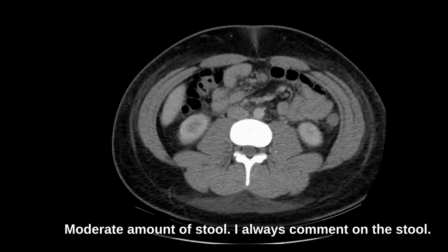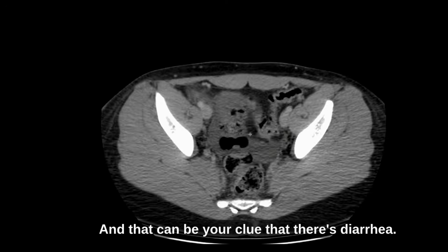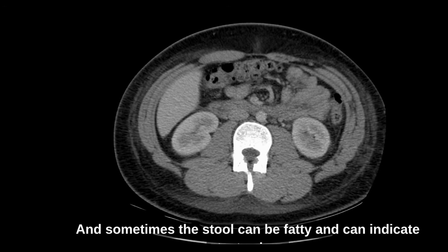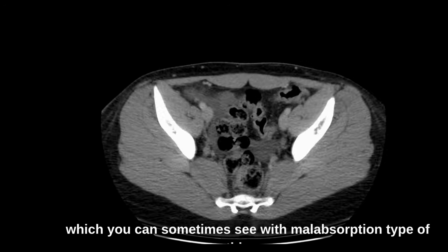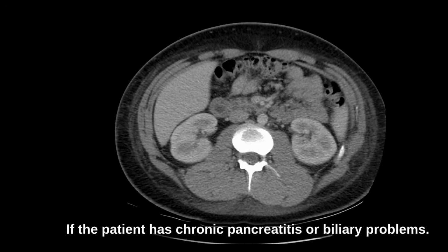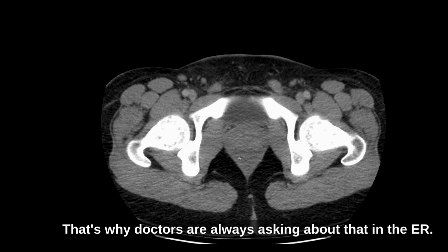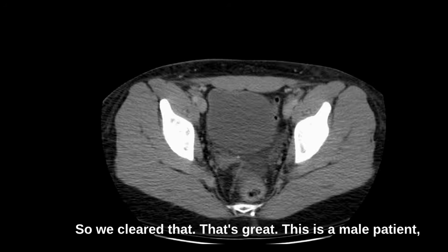I always comment on the stool. Sometimes the patient will have liquid stool, and that can be your clue that there's diarrhea, infectious colitis. Sometimes there's too much stool, constipation, and sometimes the stool can be fatty and can indicate steatorrhea, which you can sometimes see with malabsorption if the patient has chronic pancreatitis or biliary problems. So lots of information in the stool, in the urine. That's why doctors are always asking about that in the ER. So we cleared that. That's great.